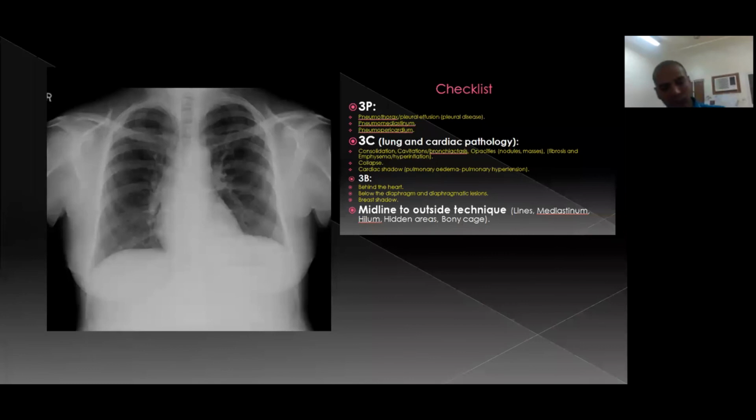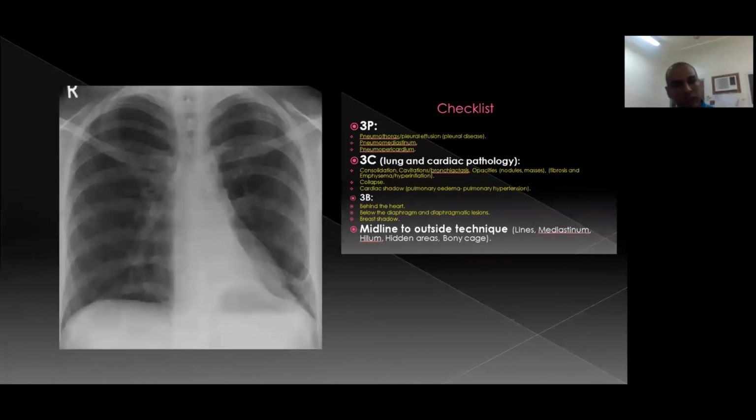Okay, thank you, Doctor. We need a volunteer here. This one is very simple. I think we have 1 or 2 X-rays in our quiz cases. We are around to finish, but we need a volunteer here. It's very easy.